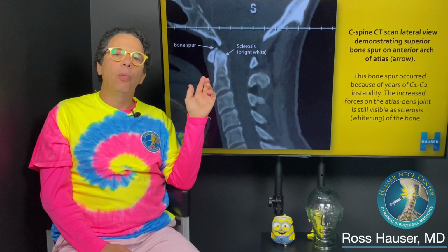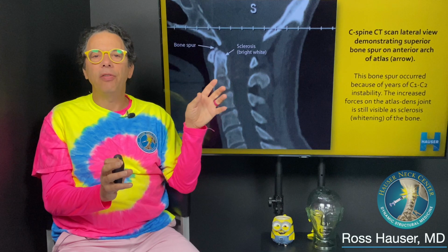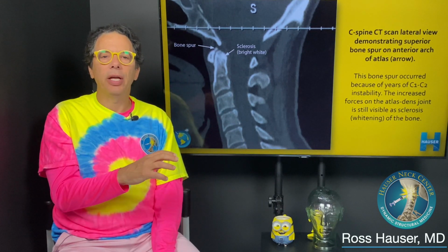And then what we're next going to show is a video where you actually see a cone beam CT scan where Brad is actually analyzing it, and he's one of our nurses, and he's awesome.